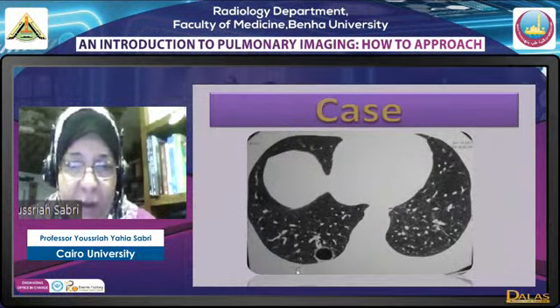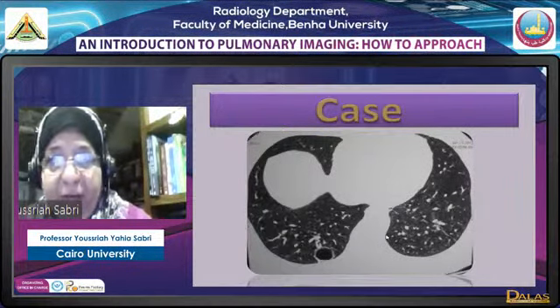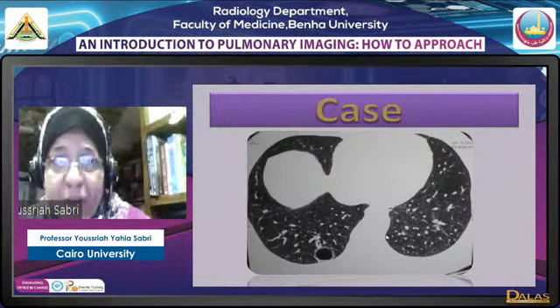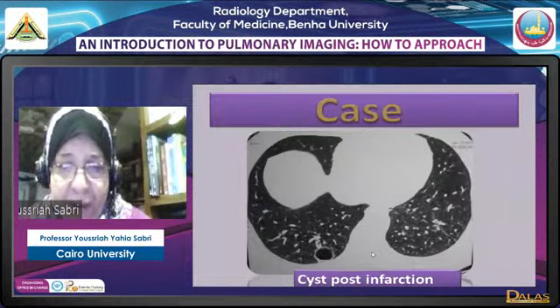Here, this cyst was a healing infarction. When a patient has an infarction, it might heal by total resolution or leaving a nodule, a fibrotic nodule, or a fibrotic parenchymal band, or leaving a cyst, as you can see here. This is a cyst which is post-infarction.